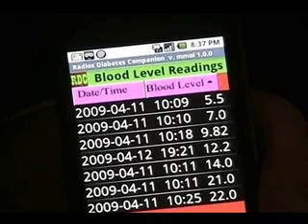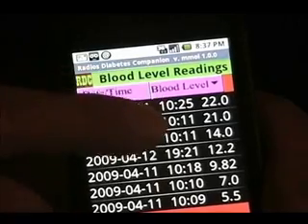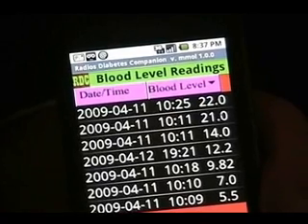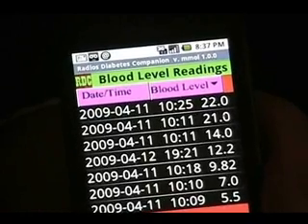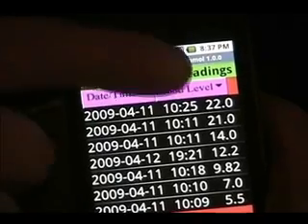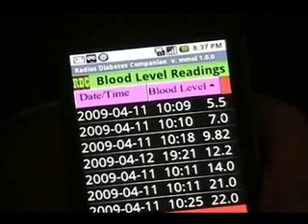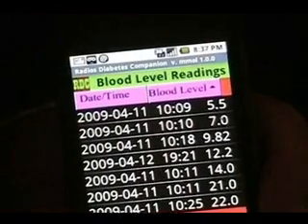Like, say you have a doctor's appointment, they're like, well, I want to see your highest readings. Click here, and you got a 22, a 21, 14. And by the way, these aren't my actual readings. I know in some of the demonstrations they really are, because I actually use the product on a daily basis when I'm good enough to get the readings every day. And so I'm in some of those caregiver situations, plus also, when I socialize to show people what I do, I give them the quick run through.